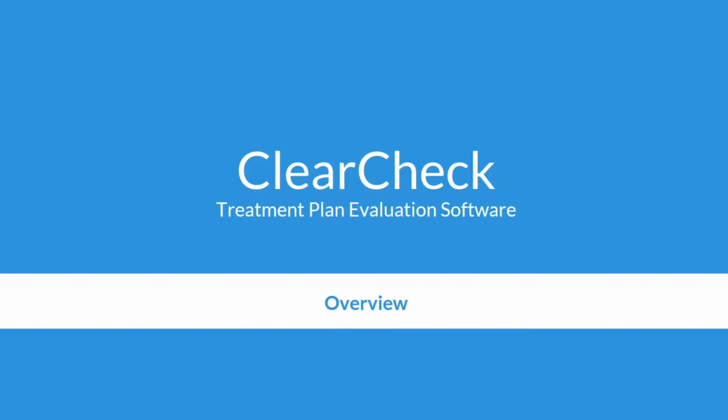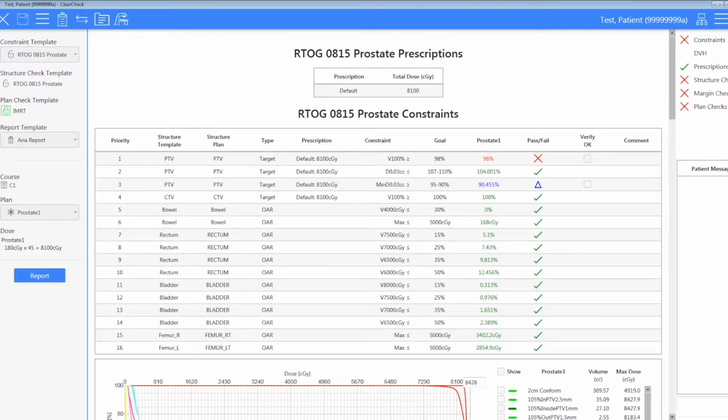ClearCheck has three main components. The first component is the main analysis window. This is where all constraint results are displayed to the user. The solid blue bar along the top indicates that you are in this mode.